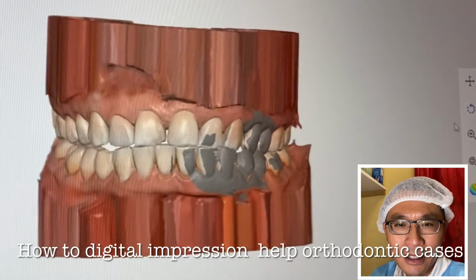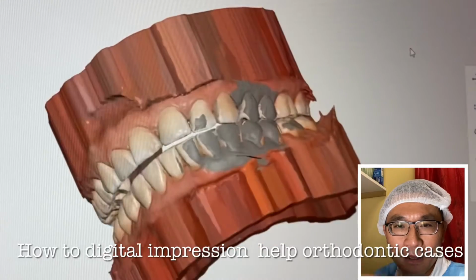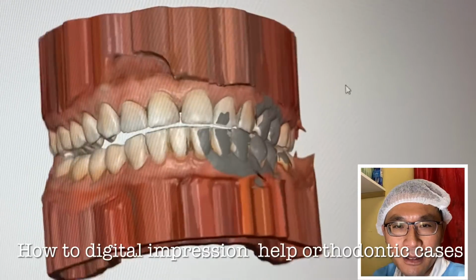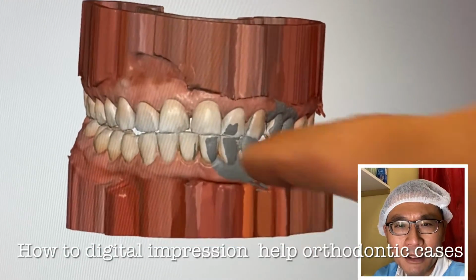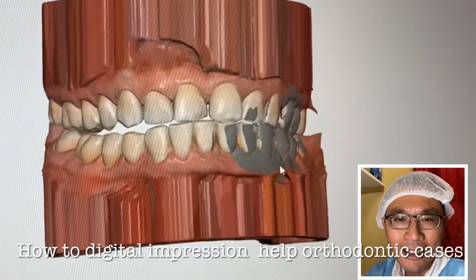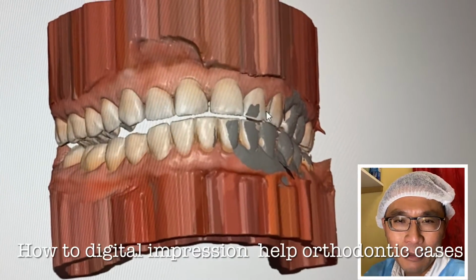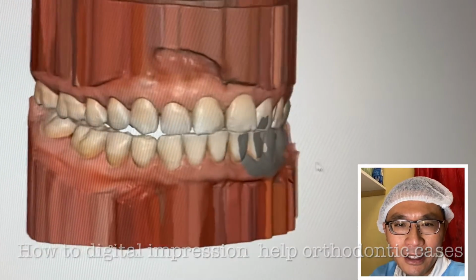here's the patient situation. Her main complaint is that she has an anterior open bite, and also her number 8 and 9. You can see 8 and 9 right here. Let me zoom in a little bit. You can see that they are kind of worn, and so that's her bite. You can easily present the treatment plan to the patient, how you can improve it.